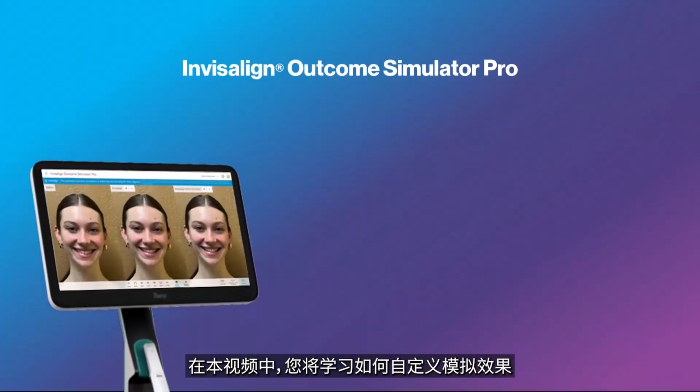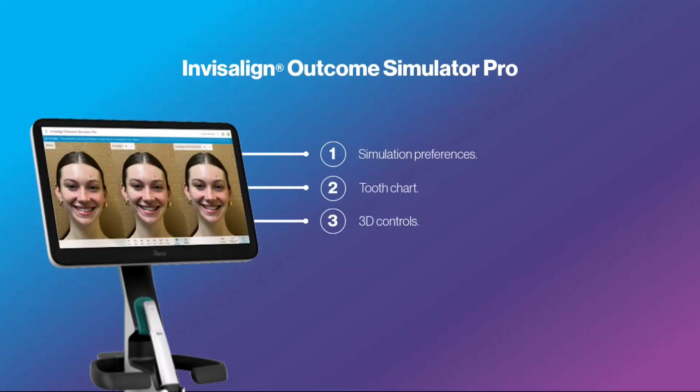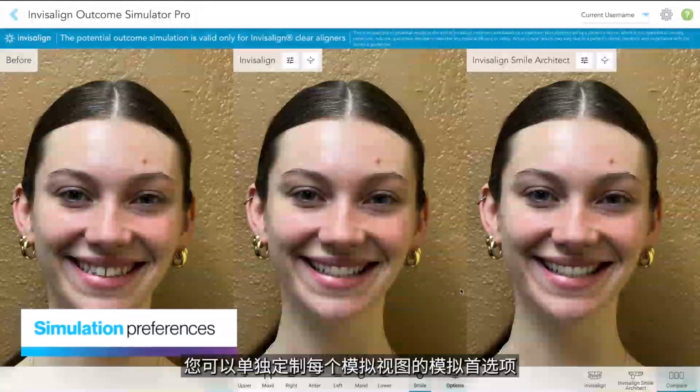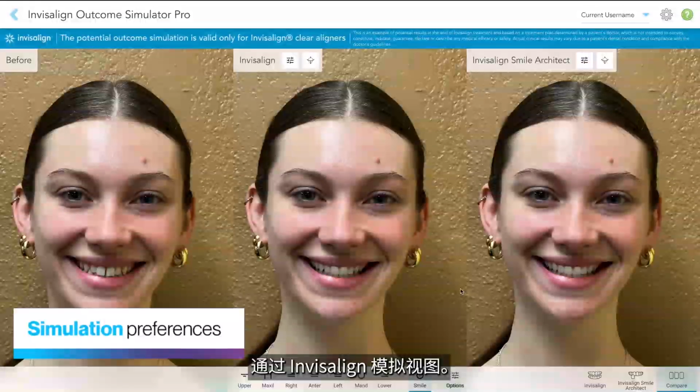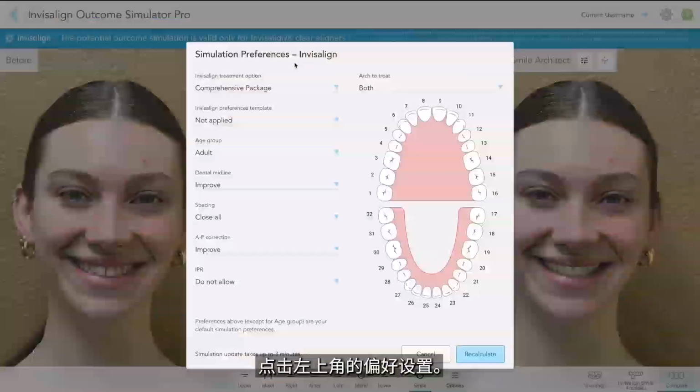In this video, you will learn how to customize your simulation using simulation preferences, the tooth chart, and 3D controls. You can customize the simulation preferences for each simulation view individually. From the Invisalign simulation view, tap Preferences in the upper left-hand corner.